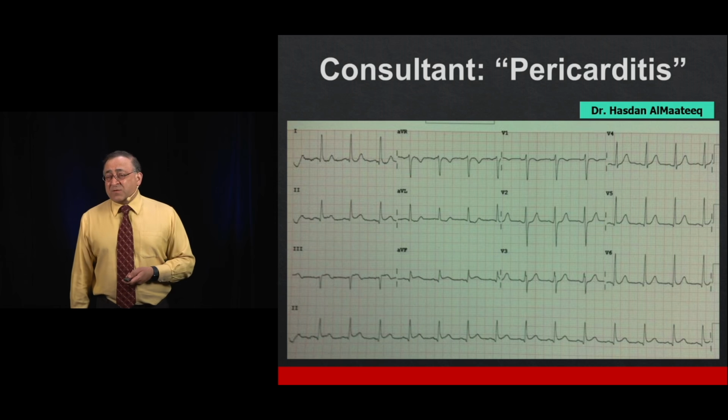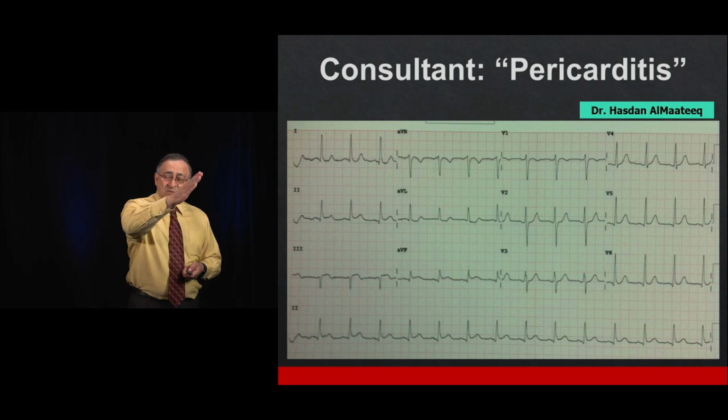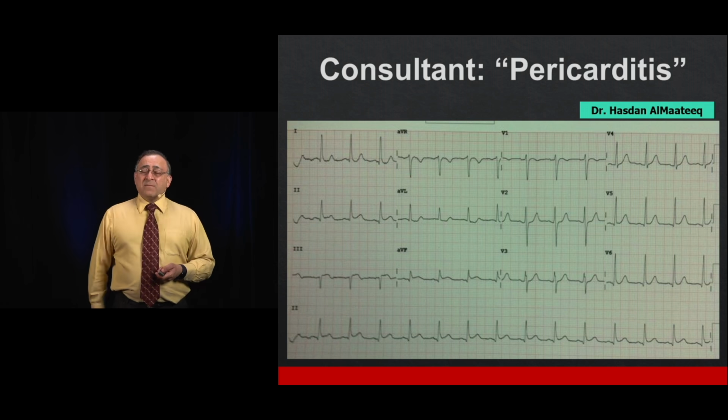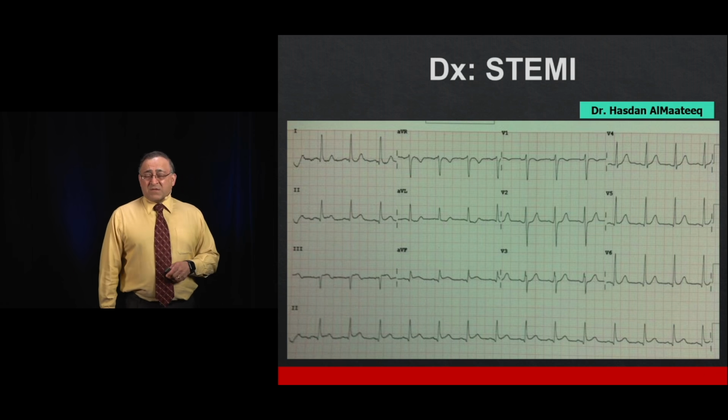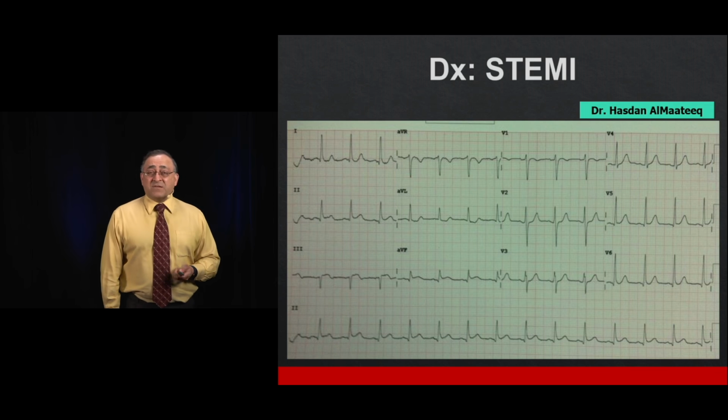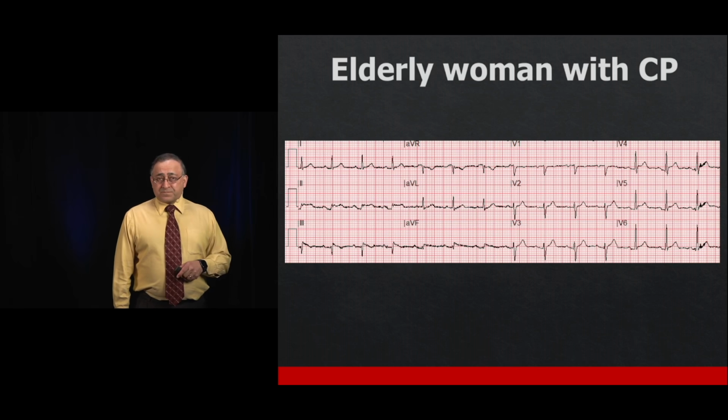This has to be an acute STEMI. Pericarditis has to give you a nice concave upwards ST segment. When you see straight, that is actually an acute STEMI. So finally, the patient ended up being diagnosed with the STEMI, but after an unnecessary delay.